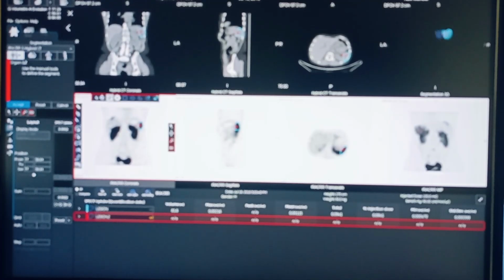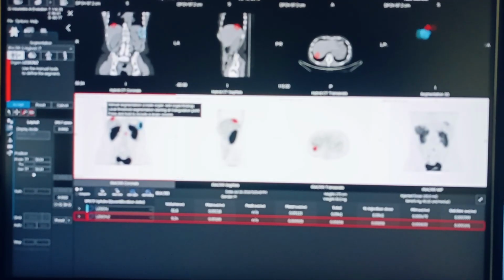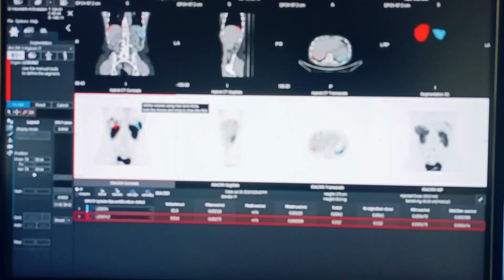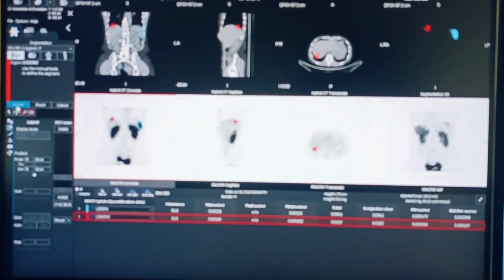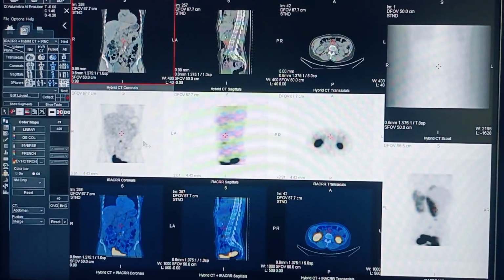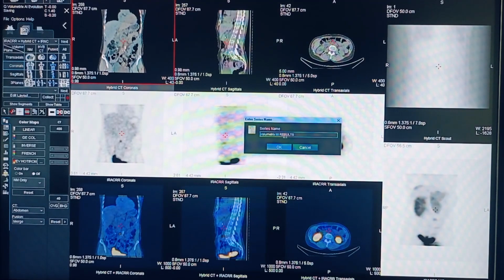And use this one to select the lesion, right? If you want to grow it further, you just click outside, it will grow again. Okay. This is too big. Then click accept and save everything. Even the quantitative information will also be saved. So you can click save and exit. The result series will be generated.